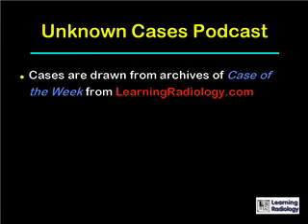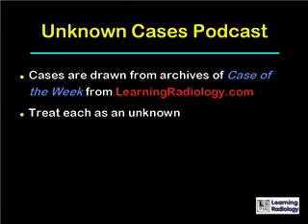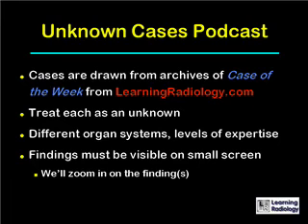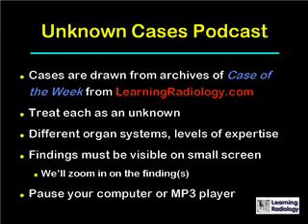These cases are drawn from the archives of the Case of the Week from learningradiology.com on the web. Treat each of them as an unknown. They're going to be in all different organ systems and at different levels of expertise. Since the findings have to be visible on a very small screen, we'll zoom in on the findings and make use of the pause control on your computer or MP3 player as you ponder the cases.